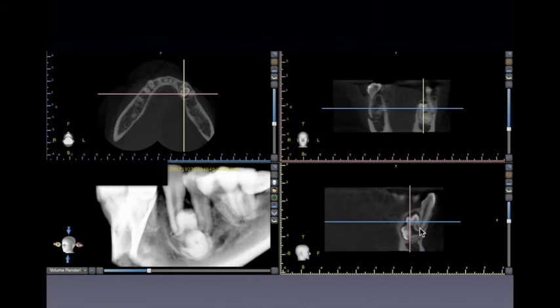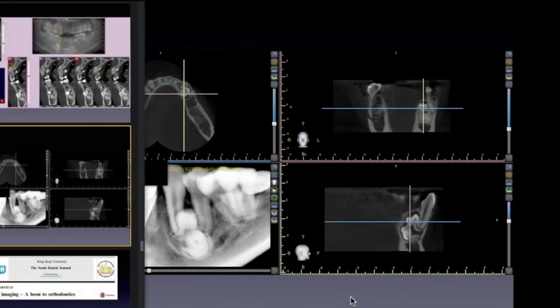Now, this goes beyond diagnosis. This goes to planning. Definitely, this will be more difficult in terms of removing, particularly that one crown is located on the lingual of a tooth, because the supernumerary impacted tooth has two crowns. So this is where, again, three-dimensional images are very, very important.